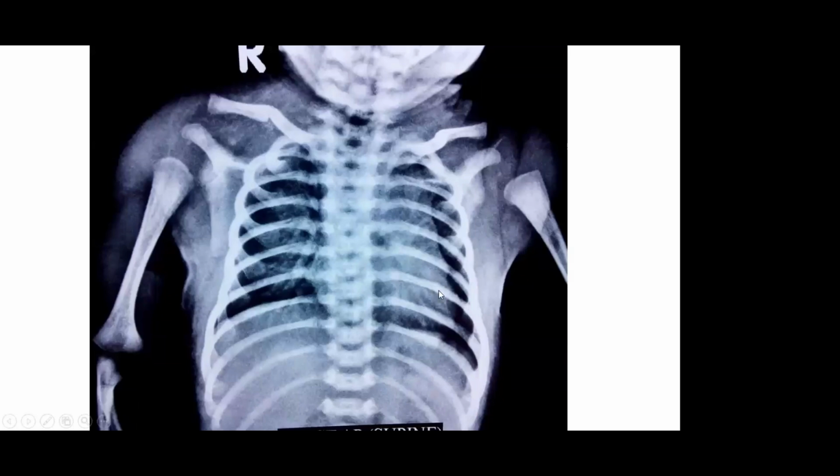This is a typical X-ray. Again, this is not an overexposed film. This is a problem with the contrast. Where you see the contrast, the difference between the phases, one which is solid versus one which has air, one which is a fluidic phase, you will see the stark difference between the phases.